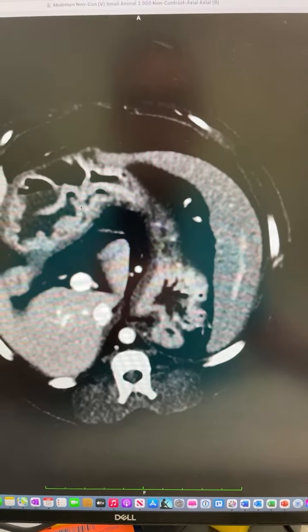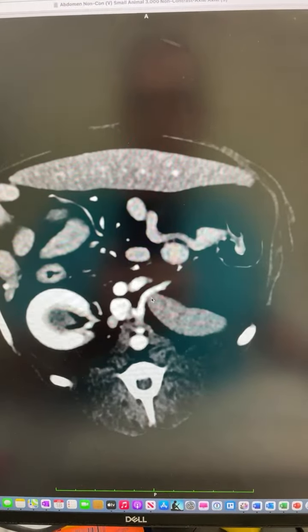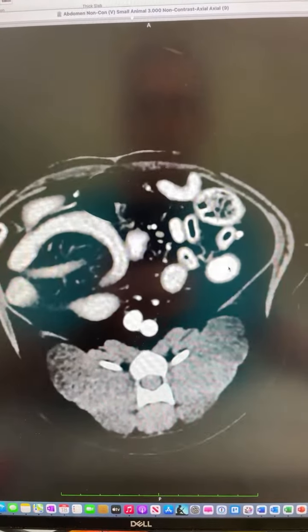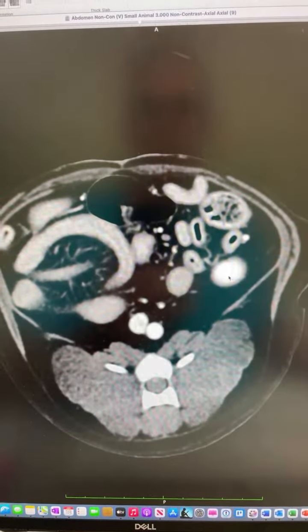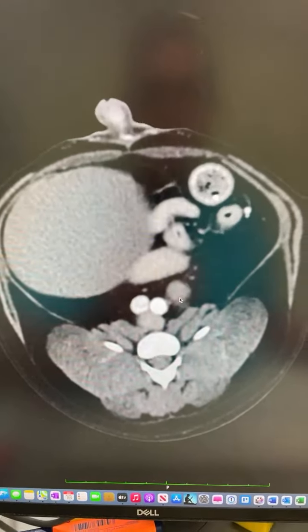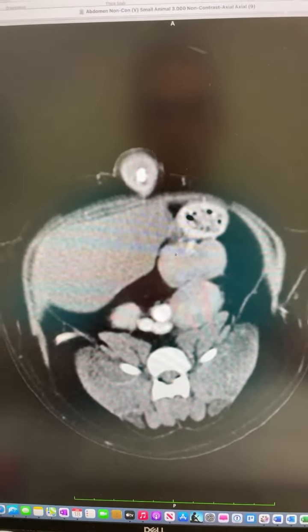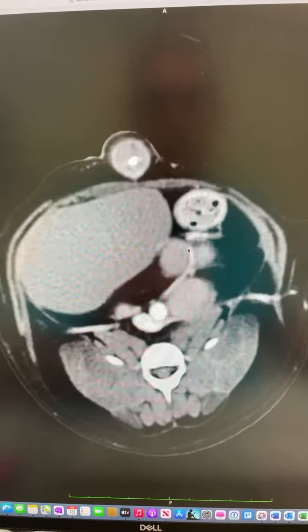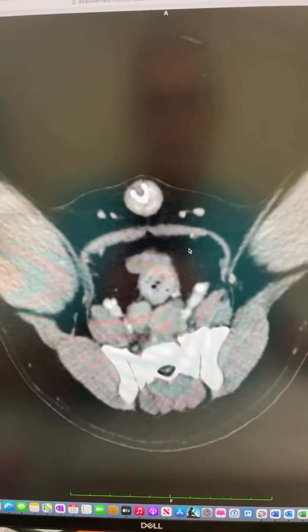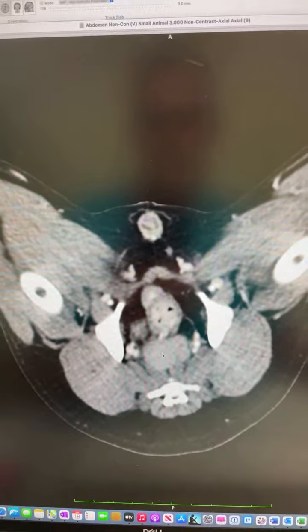That's the stomach. That's the rest of the spleen there. The right kidney, the left kidney, and then let me just lighten up this scan a little bit, we start seeing the multiple metastatic lymph nodes. There, we've got the ones climbing up the blood vessels and the lymphatics going up to the colon, multiple lymph nodes down here in medial iliac, and then in the dorsal pelvic canal.